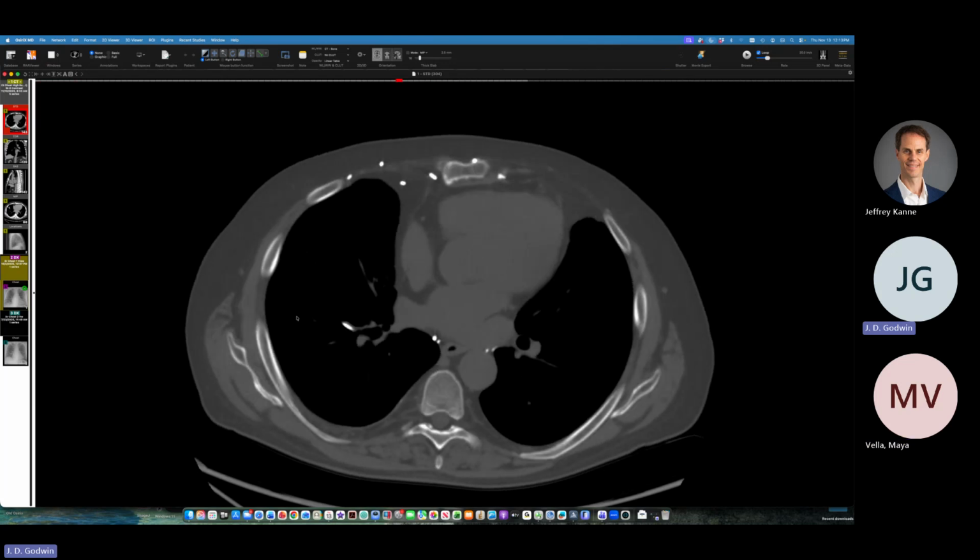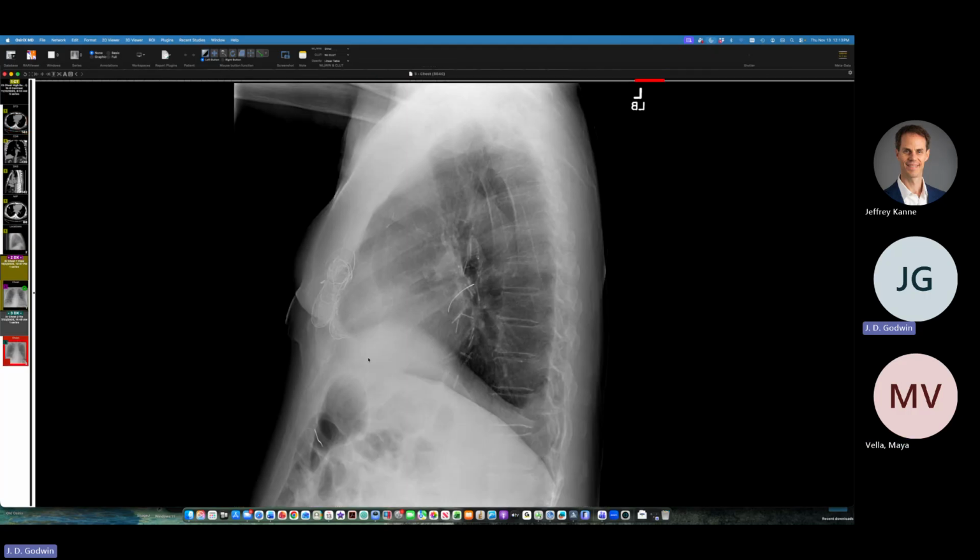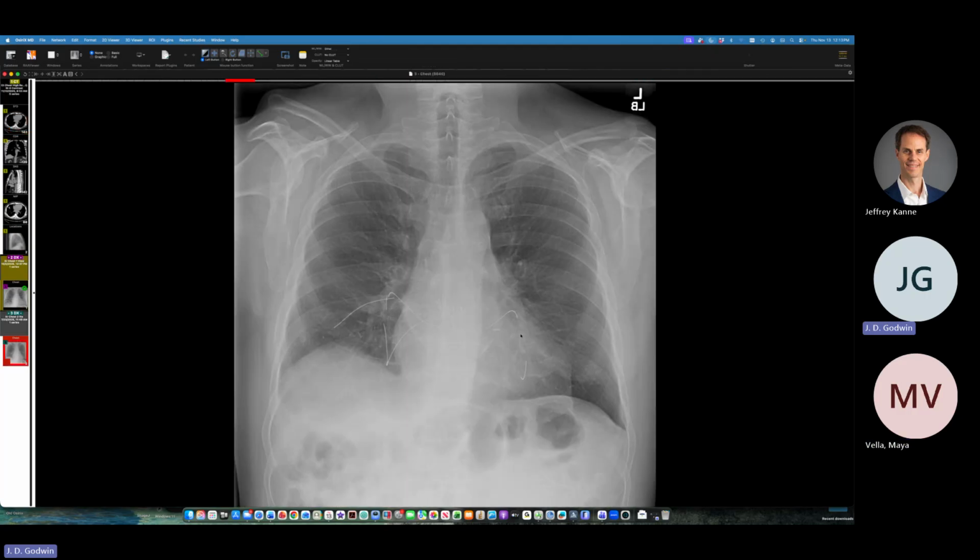So an embolic wire fragment, and I think we are seeing the donor site here because of the deficiency of wire here on the left. So, that makes sense. Yeah. Okay, so yeah, our surgeons now use plates on all the transplants. Right. Yeah. We still have one surgeon who occasionally does these cerclage wires.